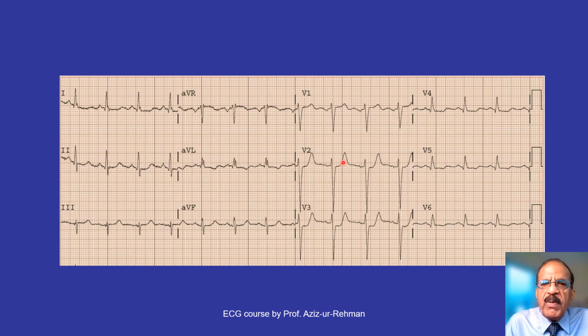You notice prominent T wave, upright prominent T wave. Not very significantly prominent R wave, because again it is perhaps a relatively acute infarction. So this ECG again in the proper context should be interpreted as posterior wall infarction, posterior wall STEMI. Troponins would be definitely needed for final confirmation.